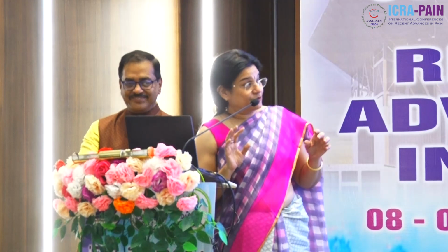But I'll run you through the other features. Once you log in, everybody will log in as a student. Of course, you can see the modules you have worked on. Like every other user, you'll be able to see your profile. Here we have a question answer section at the bottom, where you can ask queries and you can see your own queries that will come up.